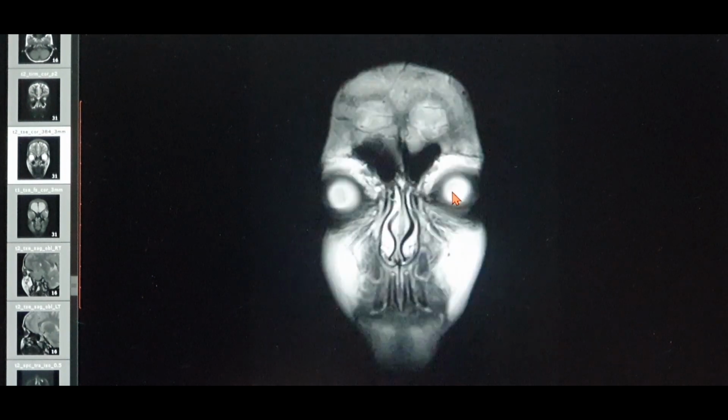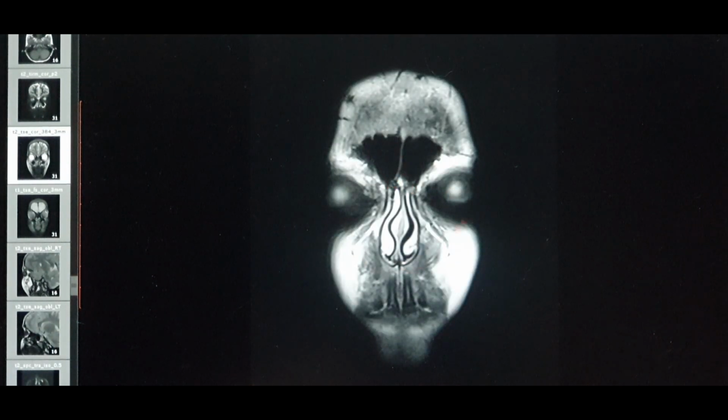As you can see over here, this is the most anterior aspect of the MRI. The bone will appear black. This is a frontal sinus, and you cannot see the bone lining. The air and bone will appear black on an MRI scan, no matter which sequence it is. The soft tissue, however, will appear bright white or gray, depending on the sequence. This frontal sinus is normal because there is no collection within; it is completely filled with air on both sides.